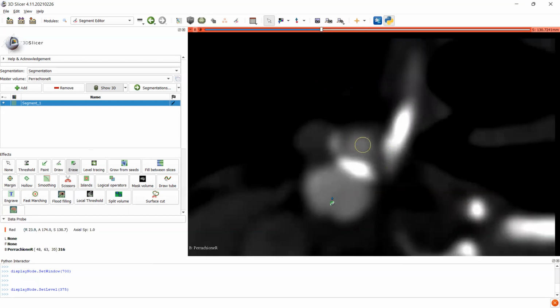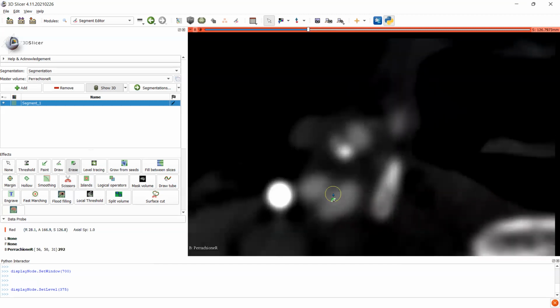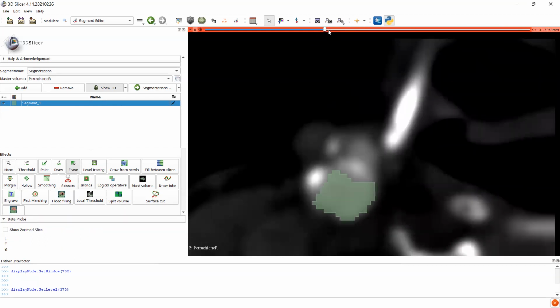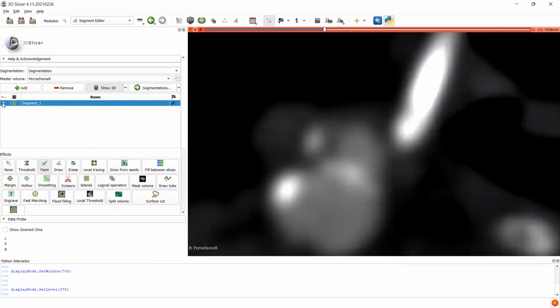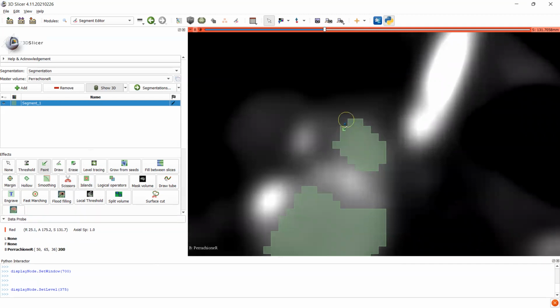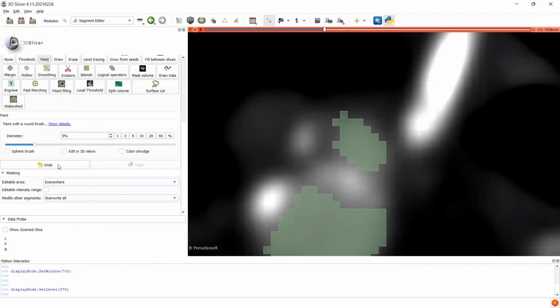This is the flow lumen for the internal, external, and they're clearly separated. So it's important to catch the branching where it actually happens, which is good. It's pretty self-evident here. And one reason for that is this is an asymptomatic patient. Asymptomatic patients are generally a little bit less fogged up than symptomatic patients, which is nice because this is an asymptomatic patient, so it should be a little bit quicker.